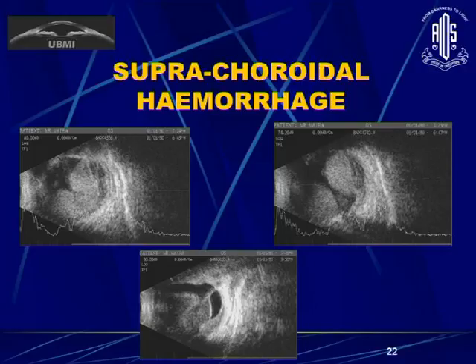So at this stage, it was a difficult thing to diagnose. This follow-up shows us that suprachoroidal hemorrhage should probably be on the mind whenever we see a choroidal mass lesion, especially in Indian settings, because we don't see melanomas that very often.